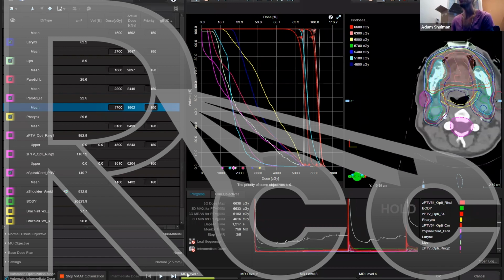In Eclipse, these different MR levels, I don't remember exactly now. I used to know, but I think in MR level 1, it starts out with like 7 gantry angles. Don't quote me on this, I could be a little bit wrong, but it starts off with a limited number of gantry angles and optimizes the MLCs. Then it moves on to a subsequent step and doubles the gantry angles, and optimizes those.